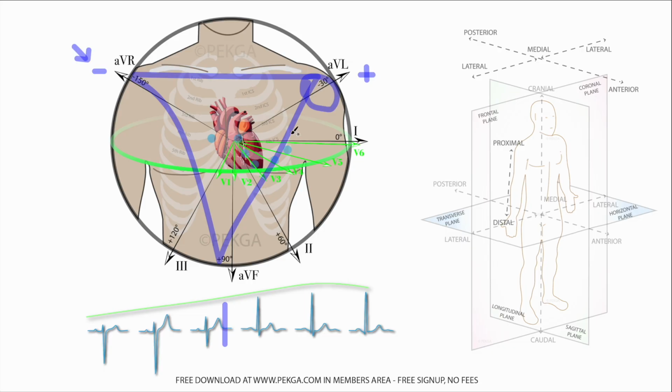Also, there is your lead 3, right? And this has one end up here and another end down here. So you could also double check this electrode, and this would correspond to your left foot, or left leg electrode. So there's 3 electrodes here that I would double check. Okay, I know that seems like a bit of an overkill, but that AVL, and sorry, let me just clean this up if we come back to it.